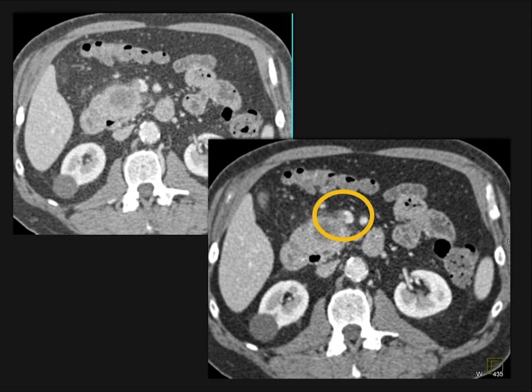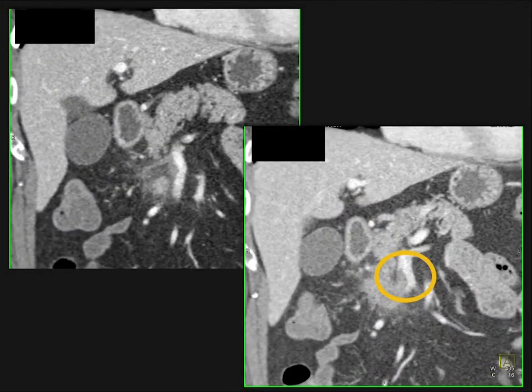The fact that tumor is necrotic, there's a lot of work being done now looking at necrosis. Is that a predictor of potential response or potential outcome? I've seen similar work in the kidney, looking at necrosis as a bad sign for tumor aggressiveness, that the more necrotic, the more aggressive the tumor is. Pancreatic cancer, there's still a lot of work being done looking at that. But again, look at the extension and you could see the involvement of the tumor. So again, a very, very nice example shown right there again.